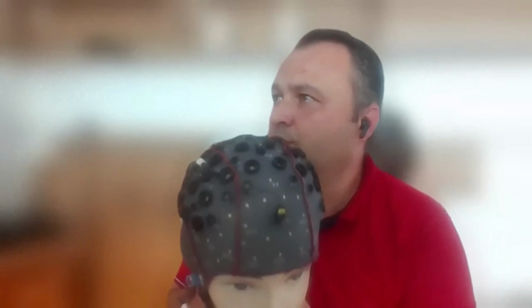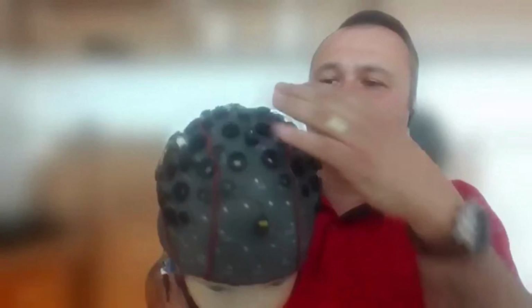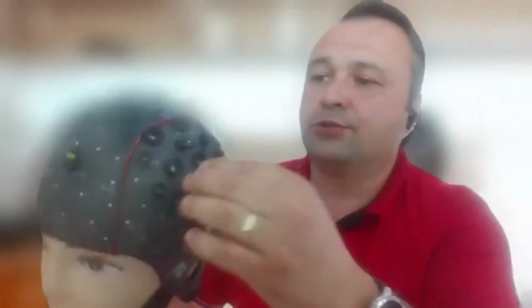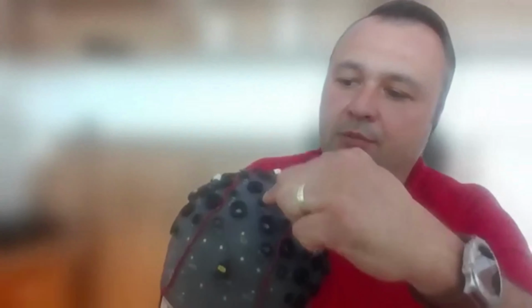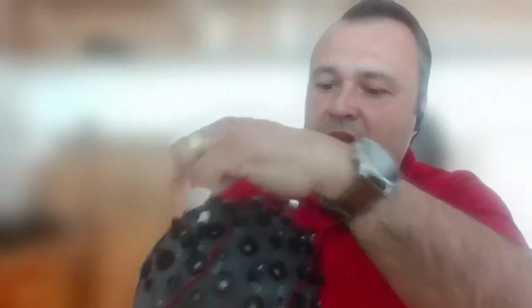In the meanwhile, because I had a question how the electrodes are counted, I first created also a physical montage. You can see it. These are all the holes from the montage that you already saw, and I added the electrodes. As I told you, from the left side, first row: this would be number 1, second one number 2, number 3. Then going back, number 4, number 5, 6, 7, 8, 9, 10, and so on, up to 16.